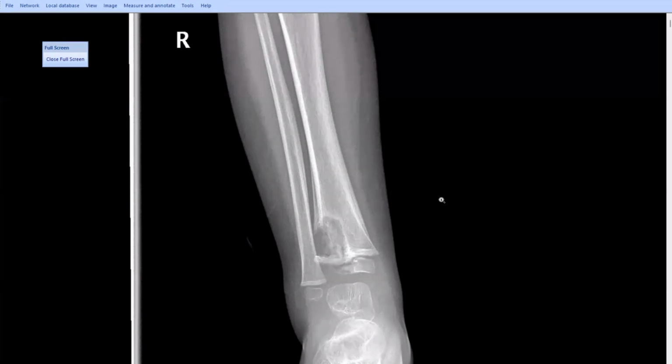This is a frontal radiograph of the leg. It shows an eccentric lucent lesion with thin sclerotic margin and narrow zone of transition seen in the distal metaphysis of the tibia with cortical breaching. And I think there's some non-aggressive periosteal reaction. I think we have just a solid fine cortical thickening. Okay, and also I think the lesion is extending into the epiphysis.